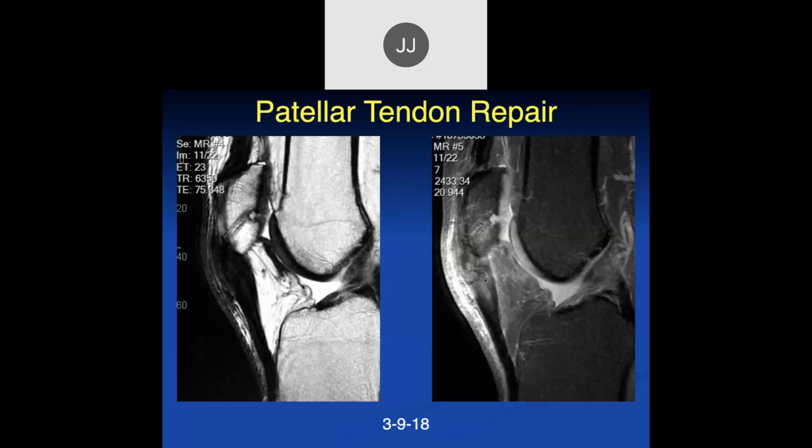I don't know. I've seen many different procedures here. This particular one looks like a suture anchor here that's more on the anterior surface. But you notice here there's a defect in the subchondral bone posteriorly, and it looks like there's a full thickness fissure going through the articular cartilage in that location. Most of the time, what I've seen, John, maybe this is what you do, is that they basically put 3 longitudinal tunnels in the patella and put 3 sutures anchoring either the superior or inferior poles, depending upon whether it's the quadriceps torn or the patella torn, and tie it in.